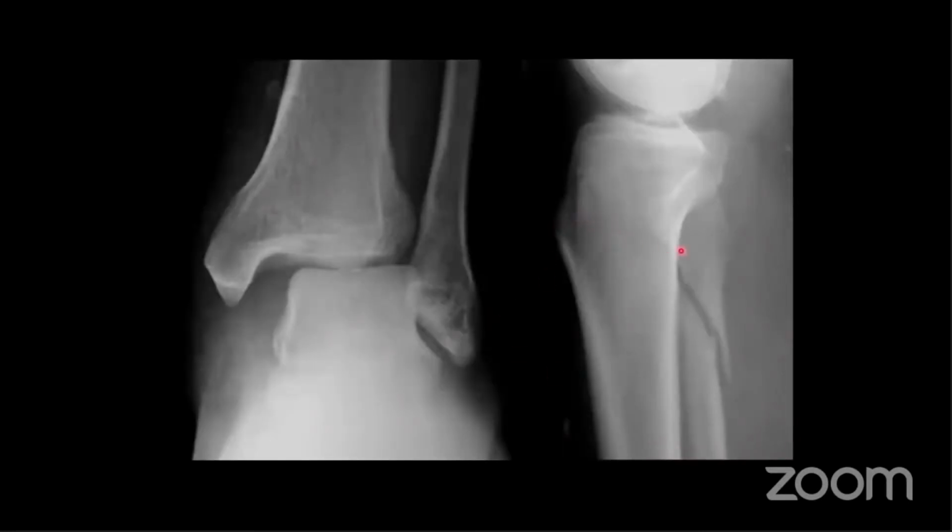So this is just another example. Again, a slightly suboptimal view of a proximal fibular fracture. And see here, there's no obvious bone injury, but this space in the ankle mortise is abnormal. Normally when you look at the mortise view, this side should be the same as this side. It should be an equal joint space all the way around. But this is clearly widened here and narrowed here. And this space is also abnormally widened. So this is all ligamentous injury. You don't have to have a fracture with the Maisonneuve. You can have one fracture up here and all ligamentous injury down in the ankle.